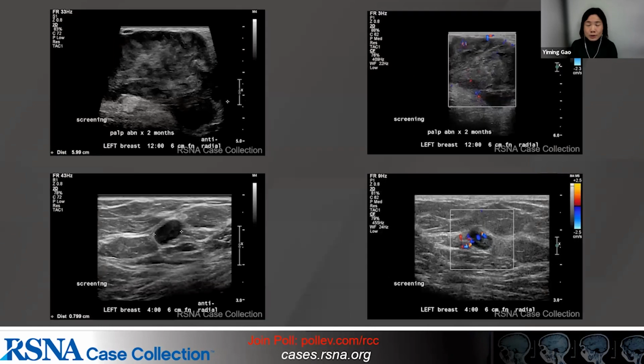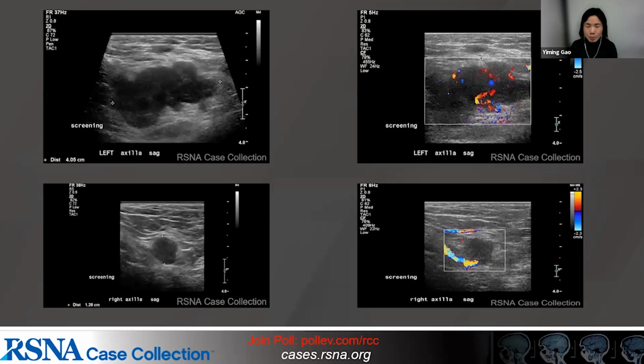So bilateral breast ultrasounds are performed and representative findings are demonstrated here. Next slide. Additional representative findings. I think ultrasound does offer a lot of morphologic details in addition to mammography. As you look at findings in terms of their marginal characteristics and internal echoes and associated vascularity. Next slide, please.